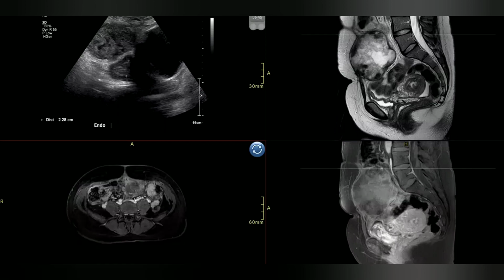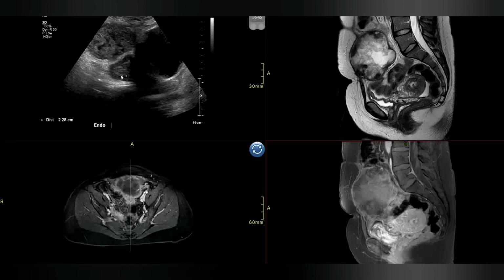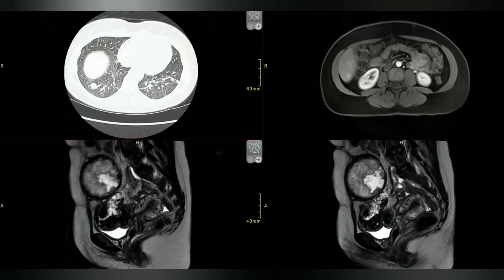Okay. And ma'am, if the patient has raised inflammatory markers and history of fever, then it can be an abscess. Okay, excellent, good. And what else? Ma'am, it can be hematoma. Yeah, hematoma, I'm not going to really say at this stage. Yes, ma'am.